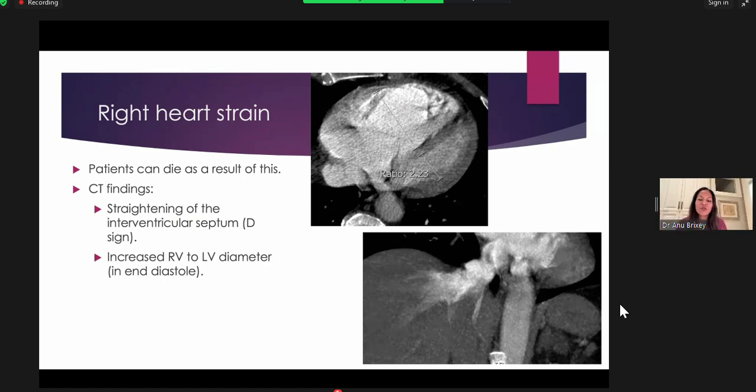I'm happy to answer that further because I know that's a complicated situation. But the point is, if you have pulmonary hypertension, you already know that your RV is eventually going to be increased. You're not necessarily going in there trying to measure an RV-LV ratio. The reason we do that in the setting of an acute PE is because these are patients that don't have pulmonary hypertension, and this might suddenly cause them to go into sudden cardiac death.